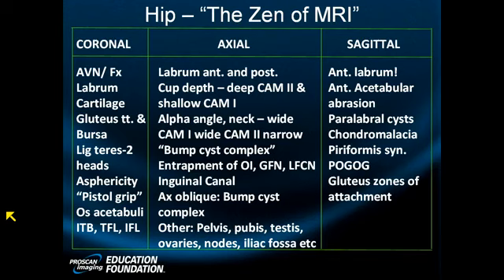This is a pretty big tear. Now some of you are saying, what's he talking about? That's the labrum. This is the tear. How easy is that? If you've seen 50 of them, it's pretty easy.